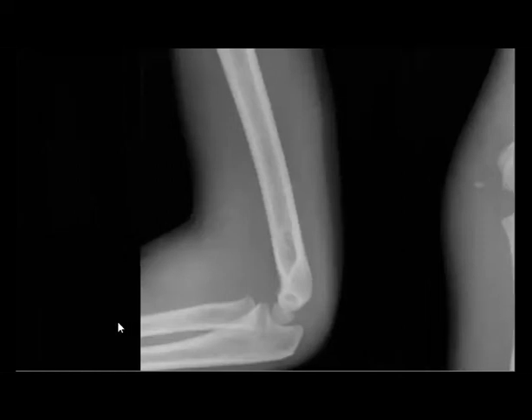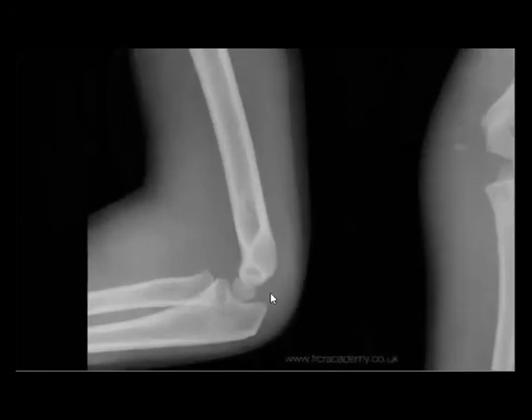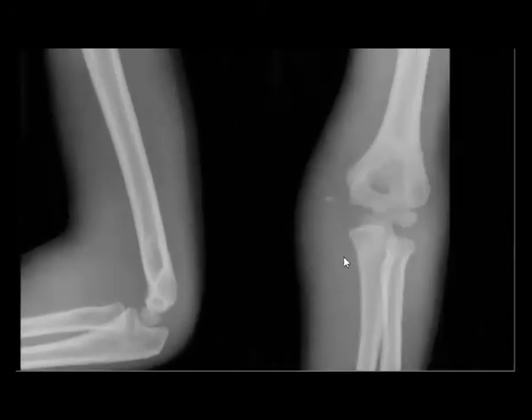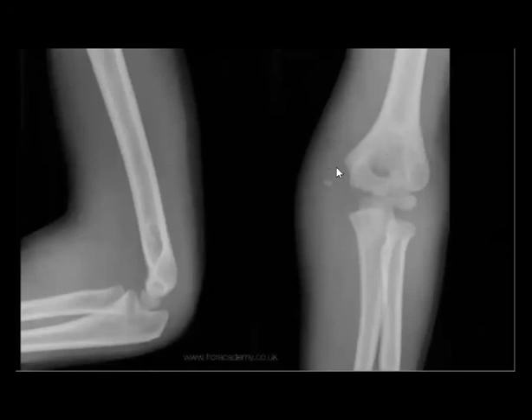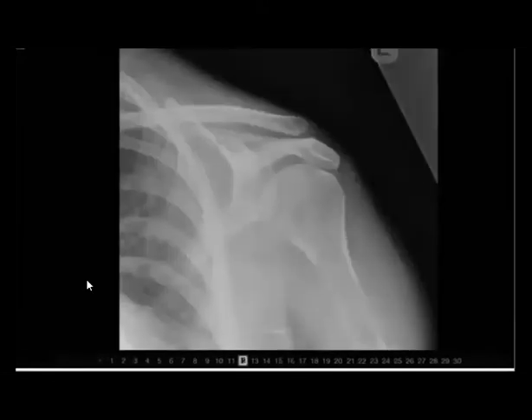Now you have your checklist. I think now if I give you one elbow of a pediatric patient, you will check the radius, the anterior humeral line, the radiocapitellar line, then check CRITOE, for example, and ensure that you will detect it easily because you have your checklist. You have something that, in a systematic way, you reach the diagnosis.